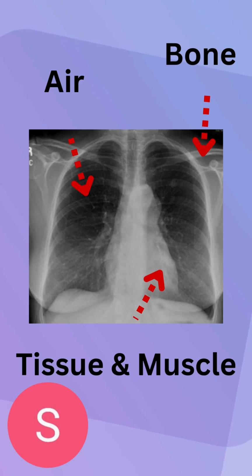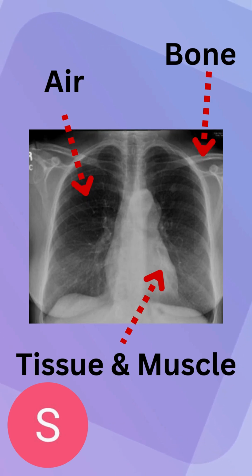Again, it's probably a reminder you've had for a really long time now, but just in case you're tuning in for the first time, this is a quick reminder that establishes the different gradients based on our background, in this case black, and establishes the different components of the X-ray.